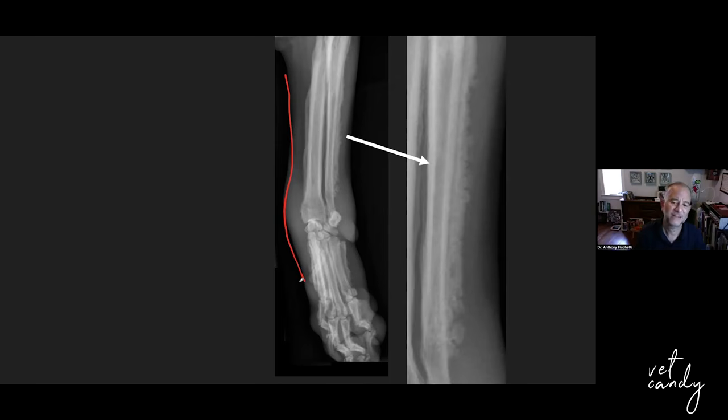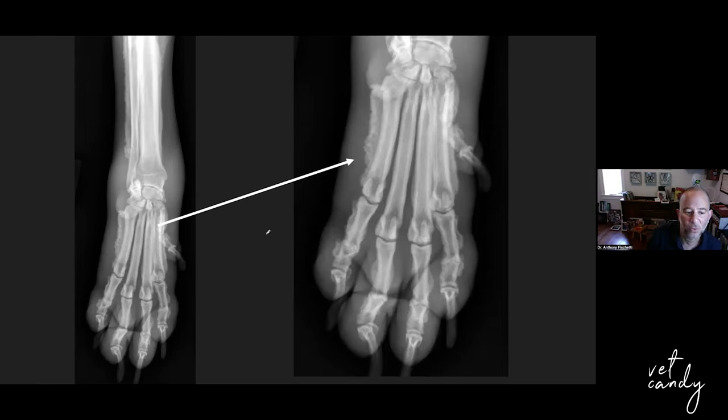So palisading periosteal reaction of the long bones, when you see this, you have to take thoracic radiographs. This is more of the palisading periosteal reaction. See all this new bone formation coming off the cortex? And it's kind of like jutting out, kind of looks like the Palisades.